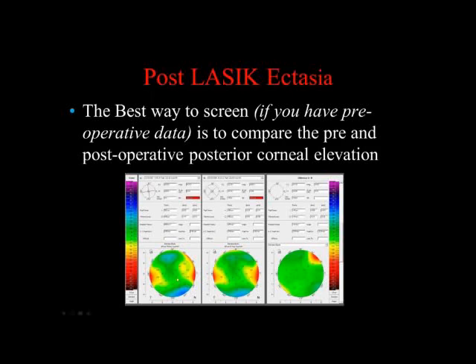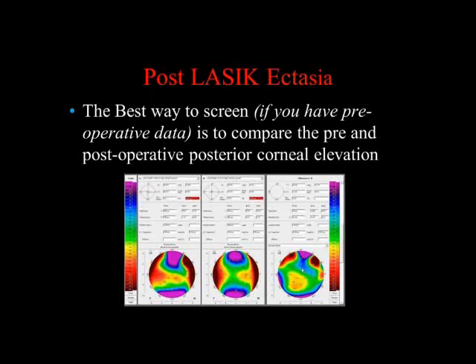So this is a post-op minus pre-op. Posterior, notice, here it is, elevation back, and the change shows almost zero. Compare that to this. Posterior, pre-op, notice this. Big ectasia here. This is a patient who doesn't develop post-LASIK ectasia, and this is the patient who has post-LASIK ectasia.